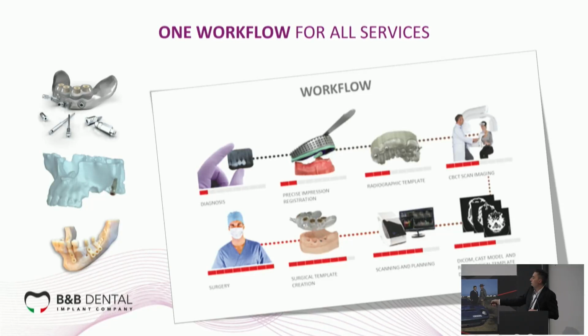The only thing that changed in this workflow is this, model and surgical template, and for the other thing, there will be the grid. For the pterygo implant, it is the same thing as for the guided surgery, changing just the grid, this step. But all the workflow is always the same.